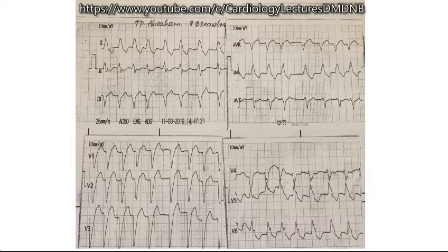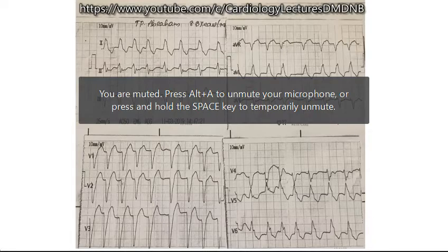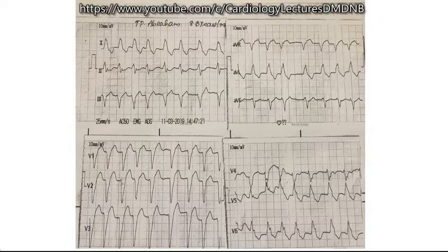One of the explanations thought of is that it may be associated with the left bundle branch block. If associated with left ventricular hypertrophy, sometimes you can get associated left axis deviation. So, in a patient with left bundle branch block, there is left axis deviation. You can always think of a possibility of associated left ventricular hypertrophy also. Okay, right. Next, we'll go to the next one.